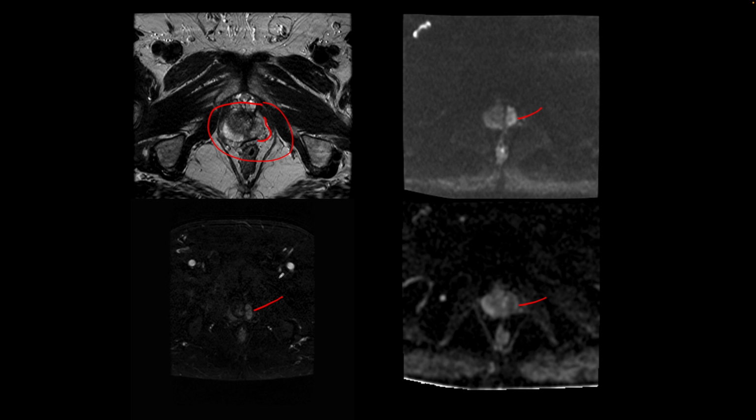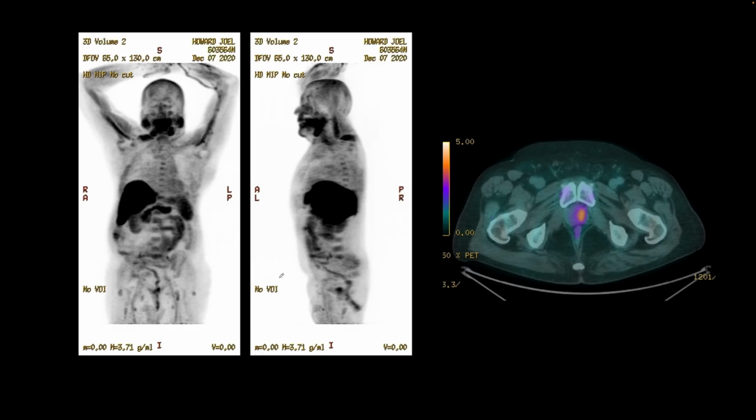Patient underwent a prostatectomy along with lymph node dissection and presented with rising PSA. And at that time, we performed a PSMA PET-CT. Well, this was actually fluciclovine and not PSMA. And on this fluciclovine PET-CT, we find this focus in the pelvis right there, suggestive of local recurrence at the site of vesico-urethral anastomosis performed after prostatectomy.